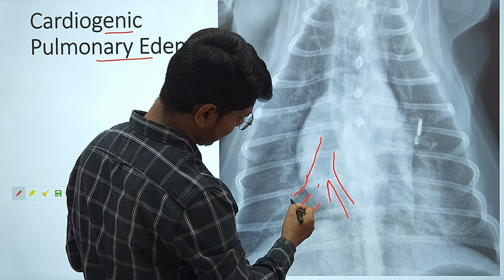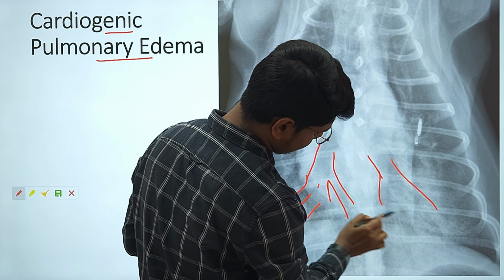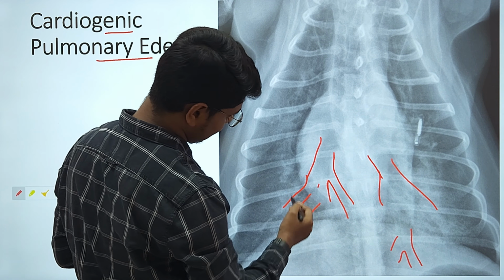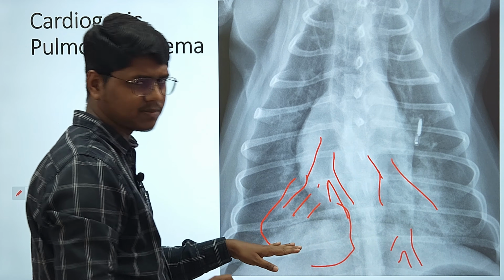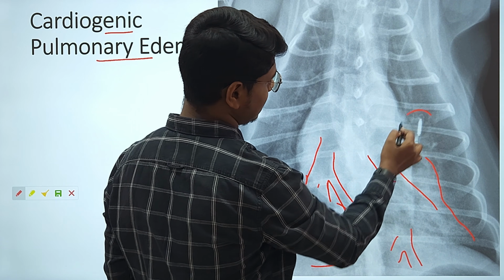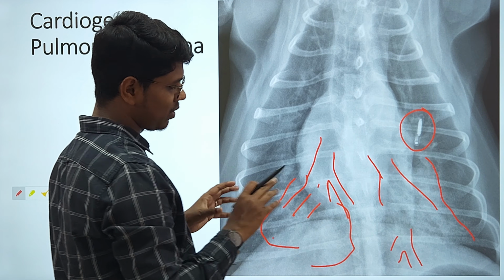Okay, bronchial pattern. Here on the other side also you can see the bronchial pattern. Like this, the bronchial pattern. Also the opacity is slightly increased, especially this one. The diaphragm has been superimposed. But you can see this intensity is increased. Here it is a microchip, so this is basically a normal finding.